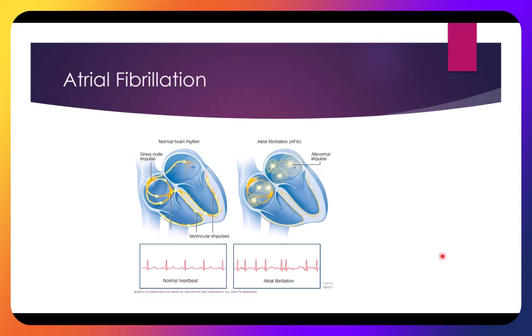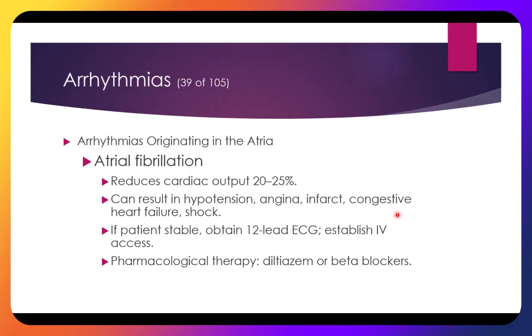And because they're firing so quickly and all at the same time, these waves are going to be much, much smaller. Or, this is important, you may not even see any wave. Okay, there are some critical criteria that will help you identify this.